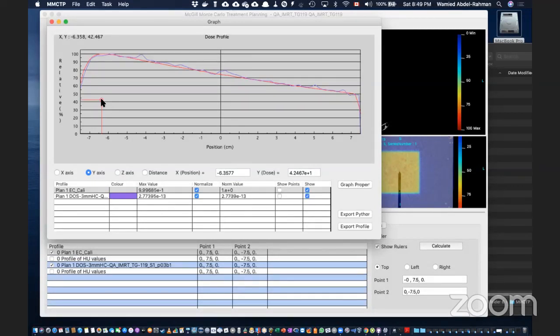Treatment planning system. So let's make another profile. This is the Monte Carlo PDD, and that is the Eclipse PDD. Okay, it's not the measurements. I'm surprised because you use the same data for Monte Carlo, the same input data. Yeah, but the planning system, we have measured data. We put it in the planning system, and it has an algorithm. It produces PDDs.